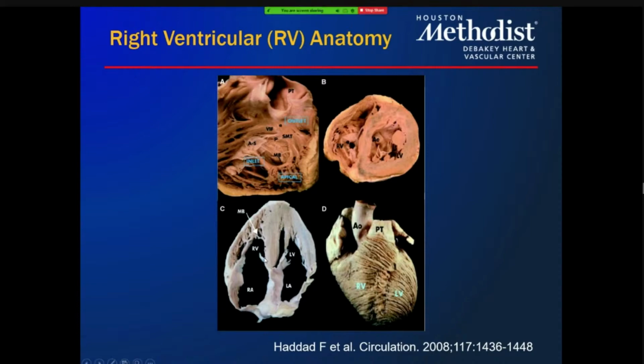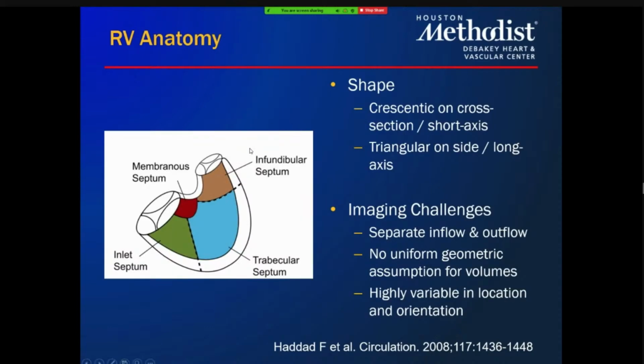It is contiguous with the left ventricle in the septum, the free wall. But if you look at enough of this anatomy, especially when we do our measurements, you'll notice that there's actually a bit of RV-LV separation in terms of the septal layer. So those are things to keep in mind. Okay, this is just rehashing what I described before, the fact that you can roughly separate it into an inlet, trabecular septum, apical region, and then the infundibular region, inflow and outflow, and apical region as well.